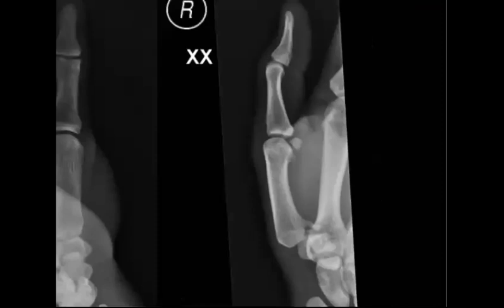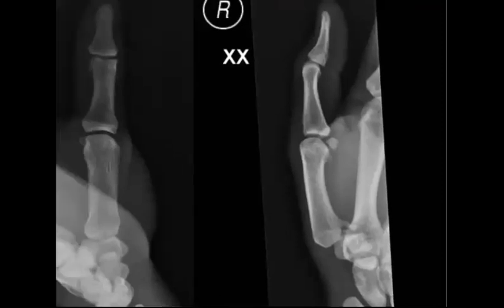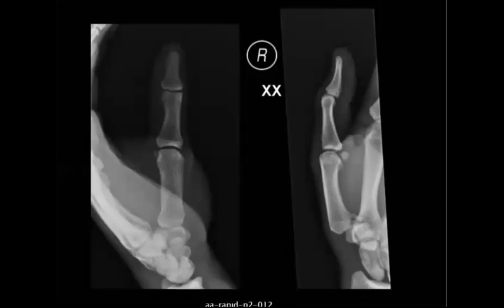This one is very important to know. So do you think that this is the fracture here? No or yes? No? Perfect. So it's not this one. This is the sesamoid bone. So where is the fracture here? It will be in the base of the fifth metacarpal here. Perfect. Huda, thank you. Of the first, sorry. I mentioned fifth. No, first metacarpal here.